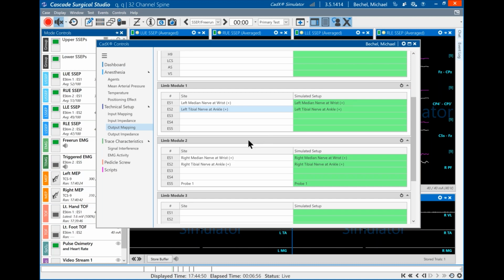You can have a trainer student scenario or a teacher and an assessee scenario, and you can hide this so you can make changes to it.